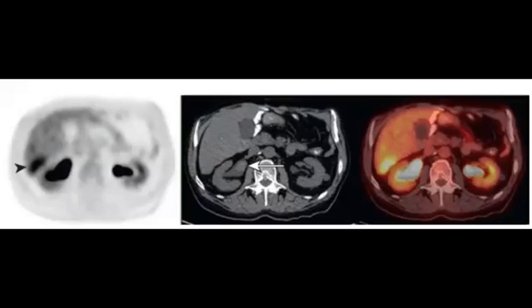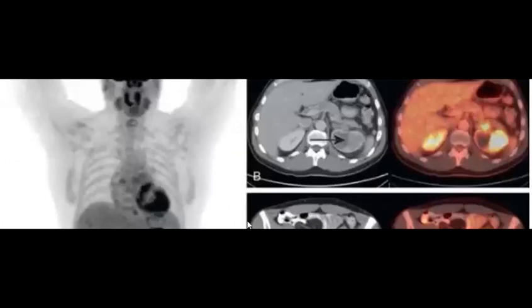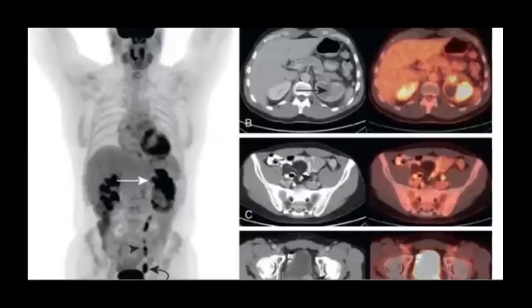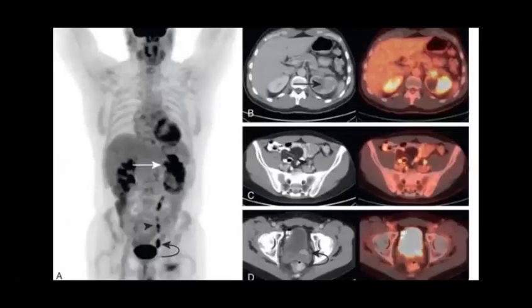Why you mentioned this? Yeah, he wants to show you on the CT, there is something here in the renal pelvis. So the most common cause of a renal pelvic tumor will be transitional cell carcinoma, metastatic to the liver. You can see very subtle that there is a lesion here, but in the PET CT, it's easier to recognize it, right? So again, sorry. So what is going on here? This is a very, very nice image.